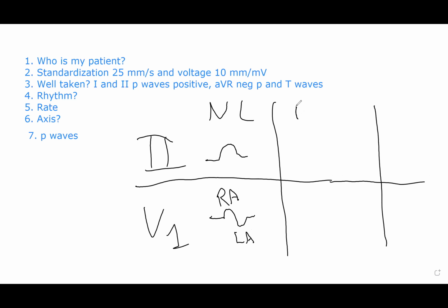Now, it also tells you about the P wave when there is left atrial enlargement and when there is right atrial enlargement. For left atrial enlargement, the best lead to see it is V1. Why? Because the LA portion will be wider and last longer. The criteria for left atrial enlargement is greater than or equal to 1 small box, in both duration and how negative this portion is.